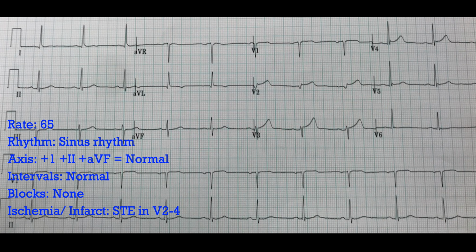Hard to say exactly what it means. I've been fooled before, but in the setting of I'm out in the field and this guy's got crushing chest pain, he's covered in sweat, I'm going to say this looks like concerning ST elevation. I would activate the cath lab on that, or at least call ahead for a STEMI alert. And if I'm wrong, I'm wrong. All right, so I'm concerned by that.